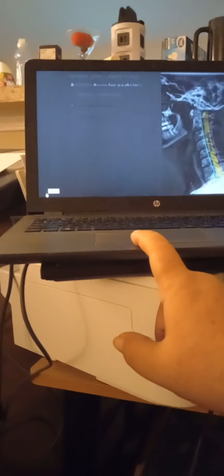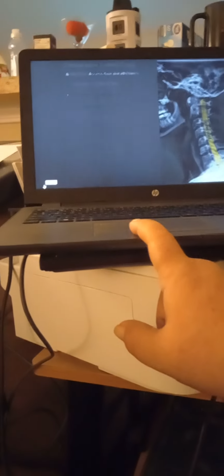The spinal laminae form the vertebral canal right there, and that's where the spinal cord is located. Right, so there's the spinal cord. Okay, so let's now go to the next A, which is the atlanto-occipital alignment.